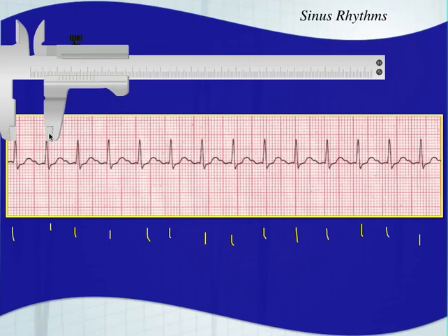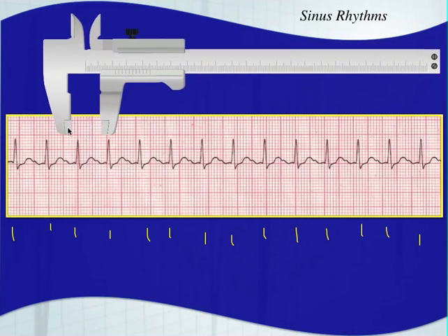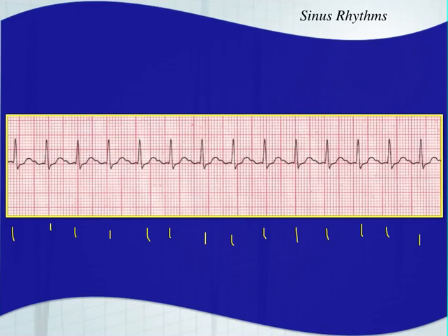It looks pretty regular, but again, it's important with these tachycardias to identify regularity. Okay, yep, it's pretty regular. That's going to stay persistent throughout. Are there P waves present? Well, remember what I told you, when you see these notches on the T waves, look at this T wave here. See a little dip? That's the beginning of the P wave, starting at that dip, and then you have the end of the P wave right here. All right, so those are P waves.